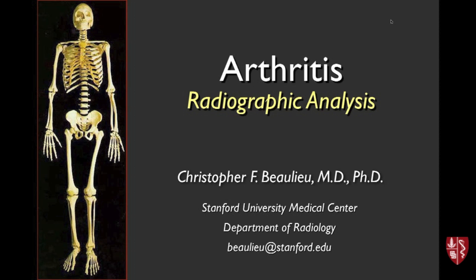I'm going to follow up on Dr. Stevens' lecture from a couple weeks ago on arthritis and really focus this morning on just showing a bunch of cases. It may not be terribly interactive, but I want to just go through a fairly large number of plain film cases of arthritis. I think this is one of the most challenging areas in MSK, and we have a reasonable volume of it that comes through here, but the key take-home point is that it takes quite a bit of careful analysis and a good background on the clinical syndromes of arthritis in order to do a good job with the radiology.